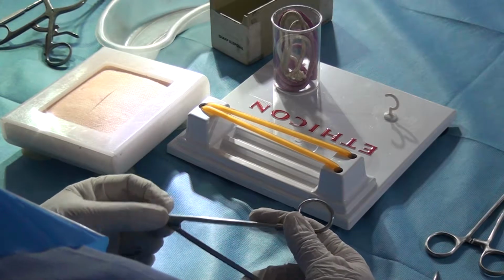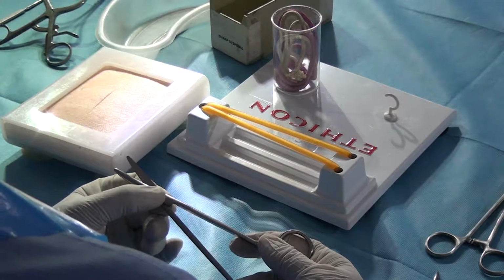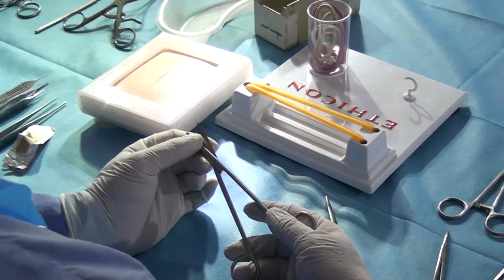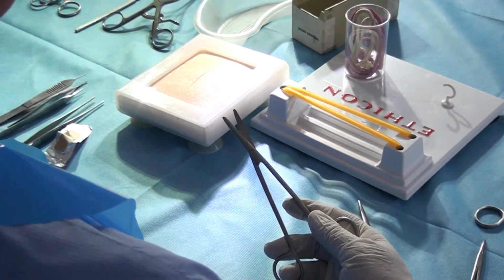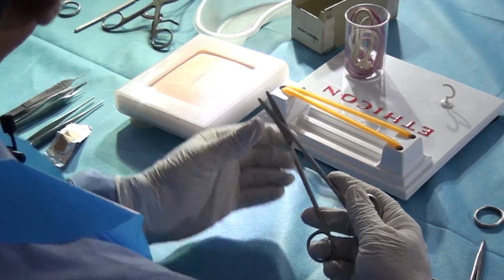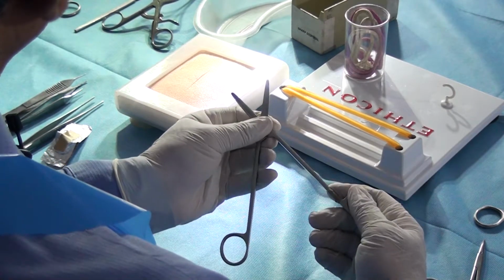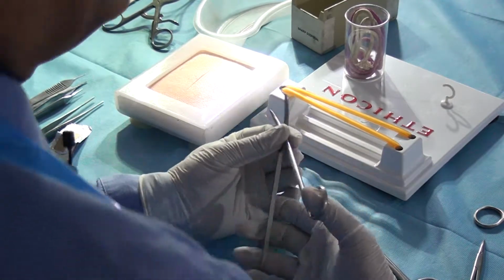Now, the difference is the fulcrum. The fulcrum is in the center in a tailor's scissor, and in a surgical scissors it goes towards the tip. Surgical scissors can be straight as well as curved. And please pay attention. That's why I asked you to stand. The curved scissors and straight scissors both exist in surgical armamentarium. But the difference between a scissors of a tailor and that of a surgeon is very clear. It's the fulcrum. Because you cut crudely as a tailor, but as a surgeon, you cut precisely.